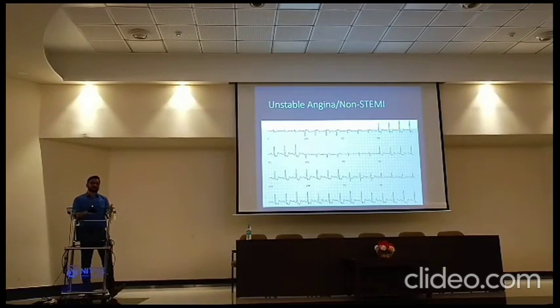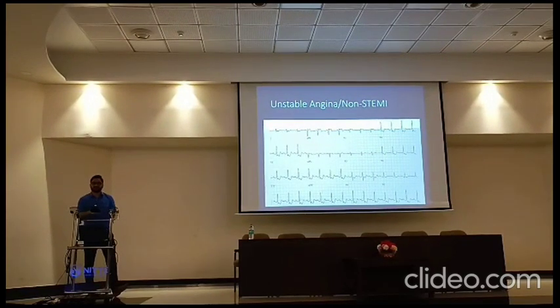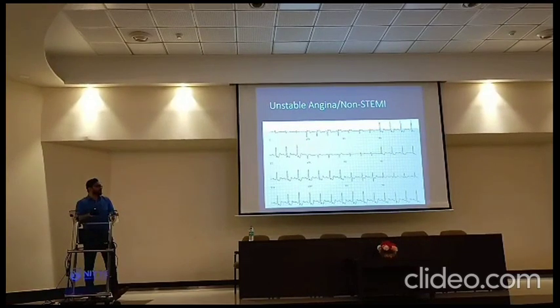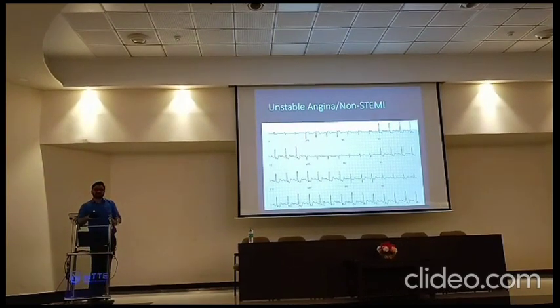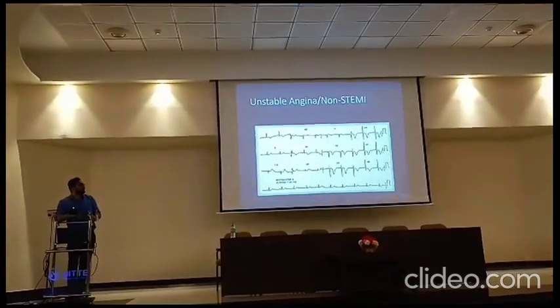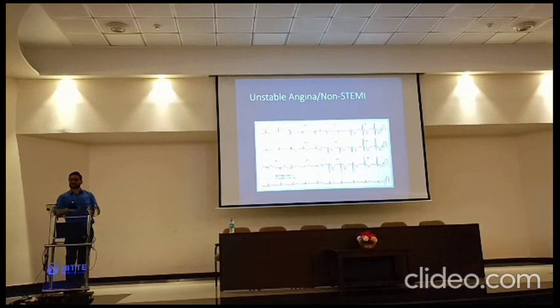The ST segment is the key segment that you need to look for to diagnose a patient having ischemia or infarction. If this ST segment is below the baseline, then it is ST depression, and if it is above the baseline, then it is called ST elevation. So understood? I hope there are no doubts with respect to ST depression.